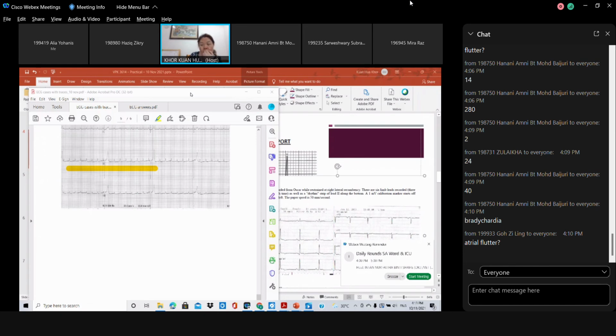What do you mean? When you calculate atrial and ventricular rates, it is normally on an abnormal ECG. There is no normal or abnormal one. If you calculate heart rate, then you want the entire complex. For example, if I ask you about atrial rates, you calculate the atrial. If I ask you about ventricular rates, you go and find the R, the QRS.